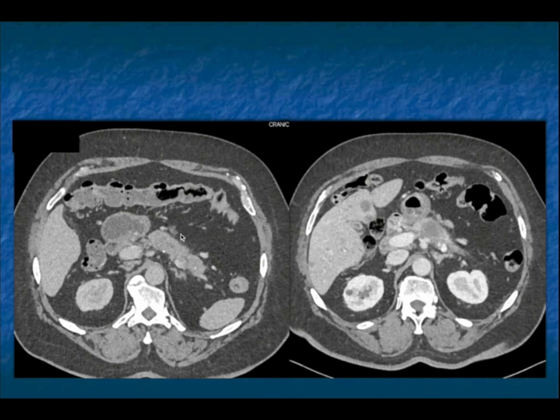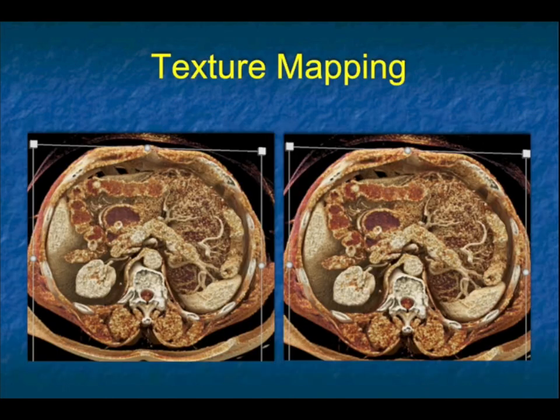Now, one can argue and say 4 months ago, would we have made a difference? Maybe the patient had liver mets, we just couldn't see them. That indeed is possible. But you can see that if you don't diagnose things early, you often are diagnosing them too late. And so in this case, you've gone from a subtle textural change in the body to an obvious tumor, with obvious widespread liver metastasis and vascular involvement as well.